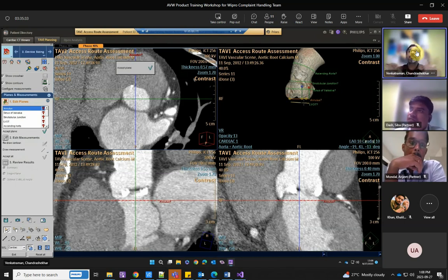You have to position how that particular stent has to be, how big it has to be, all those things. Planning is the main purpose here, basically. Unlike the CAD cases and others, where we are doing suggestions, here there are no suggestions, but we have to do the planning: what it has to be, where it has to be.